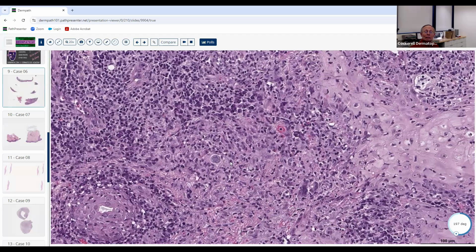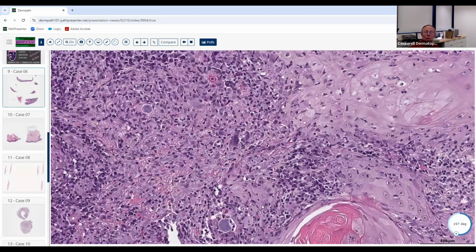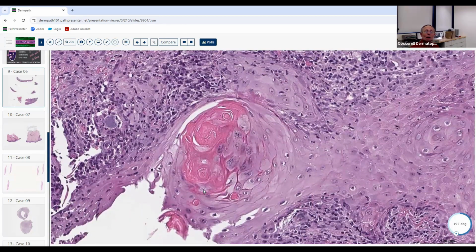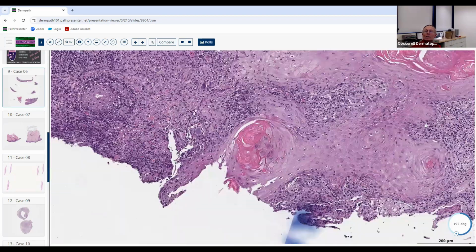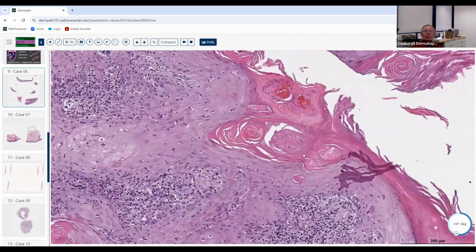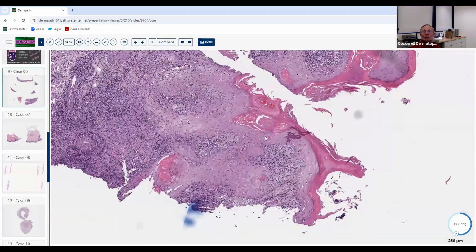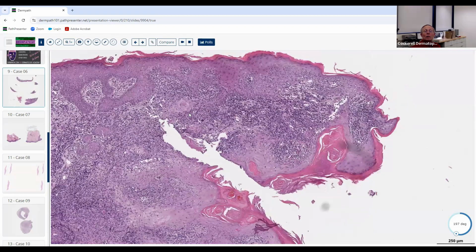Look inside multinucleated histiocytes, especially if you're looking for blasto and that kind of thing. One other thing that we'll sometimes see very rarely is the barrel-shaped arthrospores in the cornified layer, interestingly enough, of Cocci. That's very rare. You don't see that very frequently, but you can look up there too. And then the spherules often get transepidermally eliminated, so you may see them up in this area also.